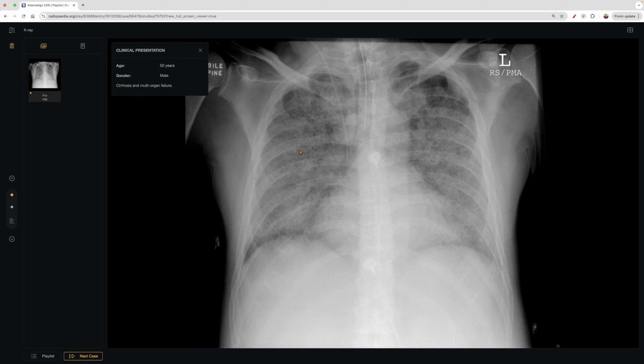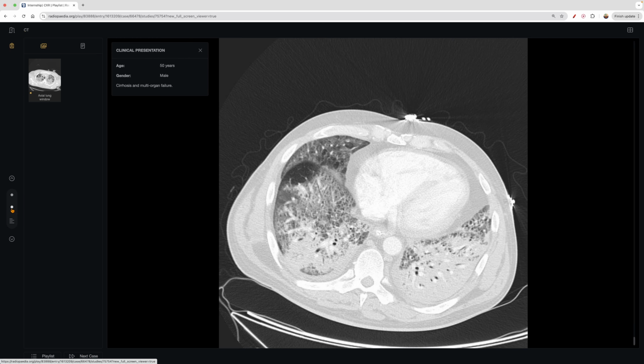Nonetheless, you can see all this consolidation here, this pulmonary edema, and you start to lose the heart, right? You can faintly see it, but you can still see the lower aspects of the lungs here, or the diaphragms. And let's see what happens with this.